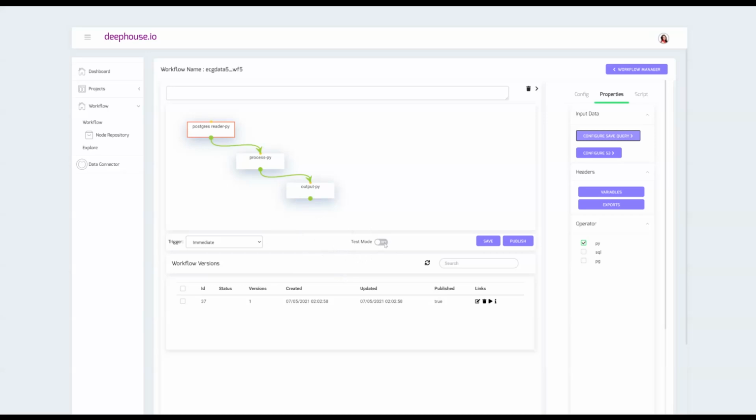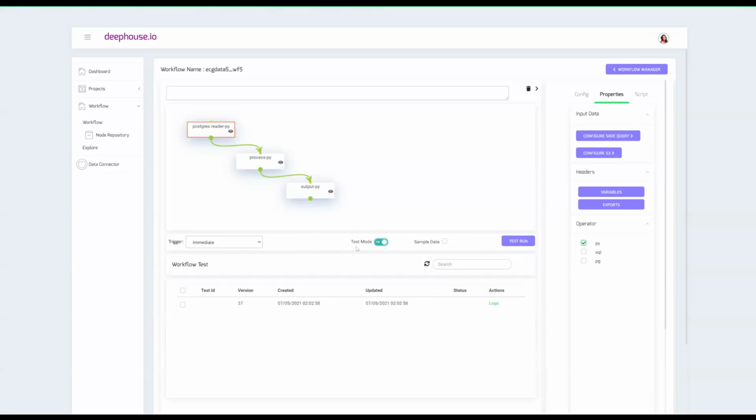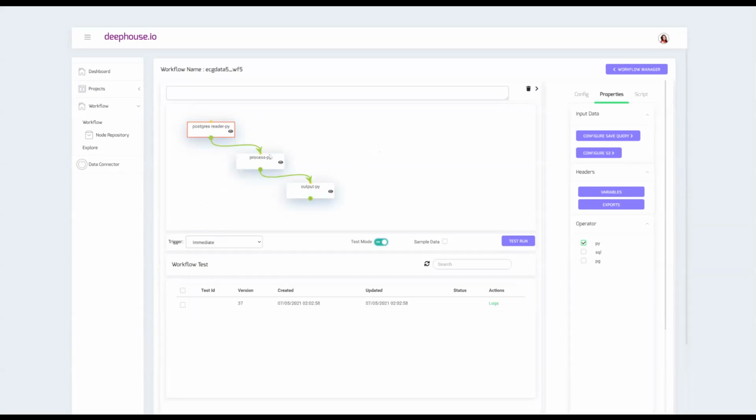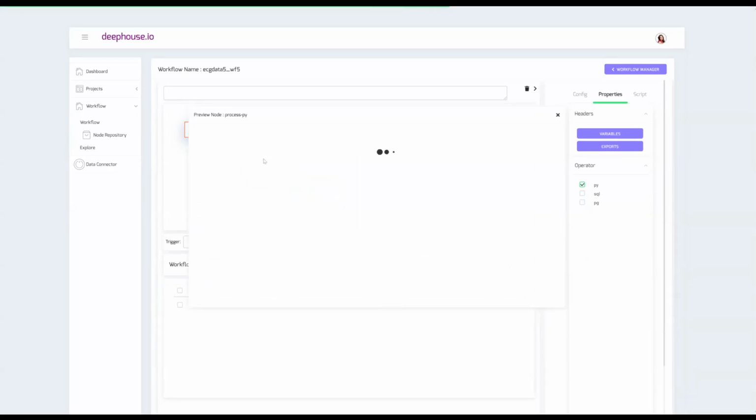One other feature is the test mode, where you can switch over to the test mode, and you can see how well the workflow will work out. And you can also take a view of the intermediate data set. For example, here we have the ingested data and the transformed data to the BPM and so forth. The space left here is for visualization, which would make it extremely useful for the data engineer.